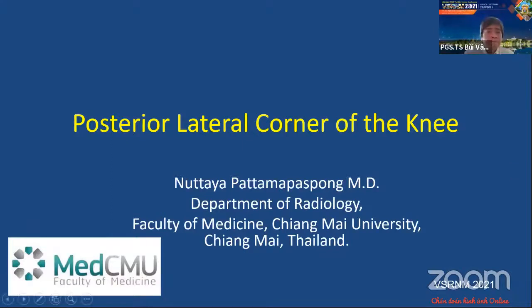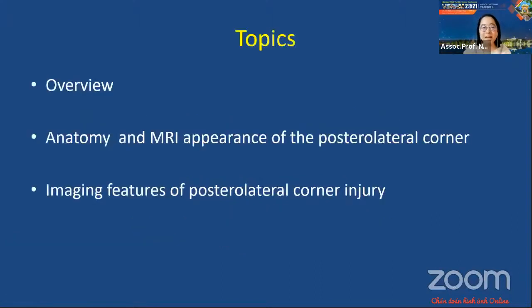Thank you for the invitation, and it is my pleasure to be here with you, talking about the posterior lateral corner of the knee. In this topic I will highlight the anatomy and MRI appearance of the posterior lateral corner of the knee, and show you when we will call it injured.